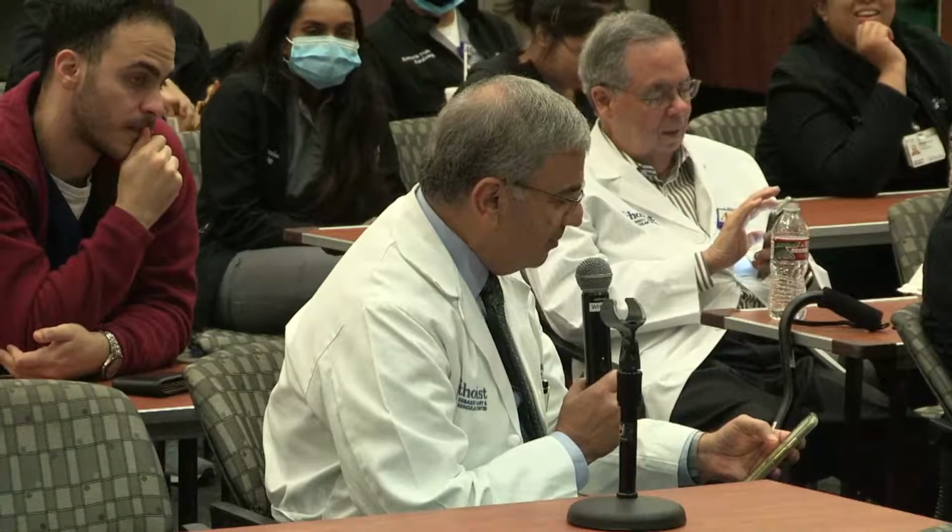Said bone uptake is normal, and in particular in the bone marrow, and usually increases with infection. So there is a certain threshold, I presume, that you're going to go beyond. Thank you, Dr. Al-Mallah, from Argentina.